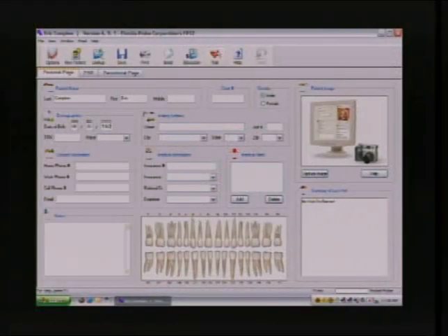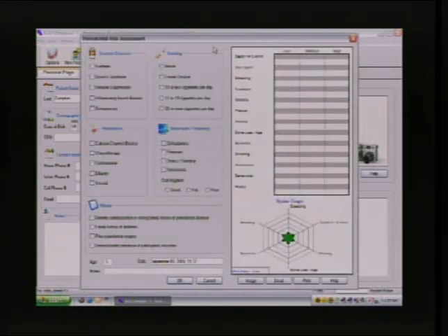Step two, there's a heart icon here. This is our periodontal risk assessment. And this is really a query of inherent risk for the patient. So based upon their systemic health, diabetes, immune suppression, Down syndrome, things like that, their smoking habits, behavioral and temporary factors, pregnant, orthodontia, bruxism, xerostomia.